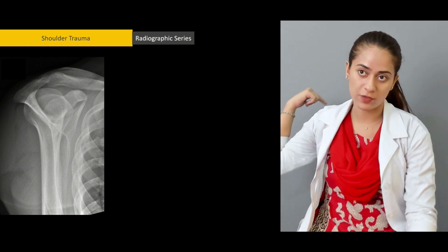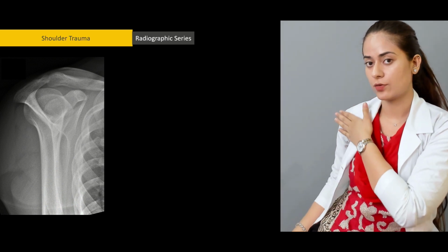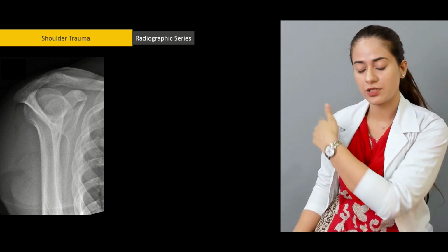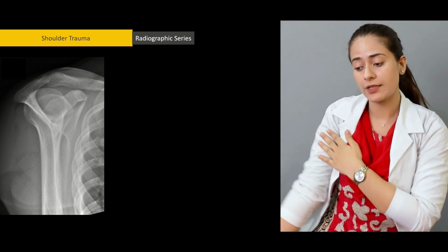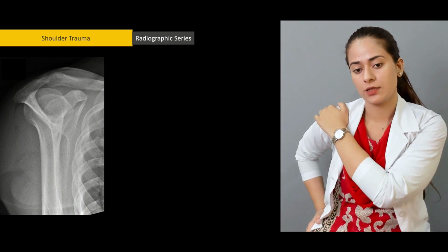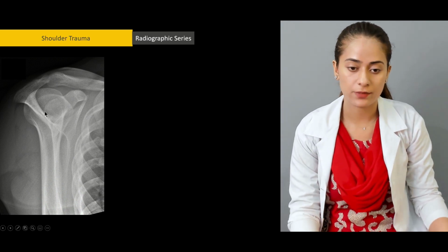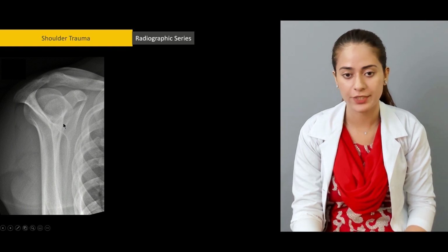So the X-rays are coming from the posterior side, and the bucky is here, and the patient is placed in this orientation. So the 45-degree tilt, and the bucky is in front of the patient, so it's a posterior lateral view. This is the orientation in which this view is taken, and the shoulder is internally rotated. The hand can also be placed on the hip, and that will give a better visualization and a better Y view. But in this radiograph specifically, this humerus is internally rotated. So this is a normal radiograph.